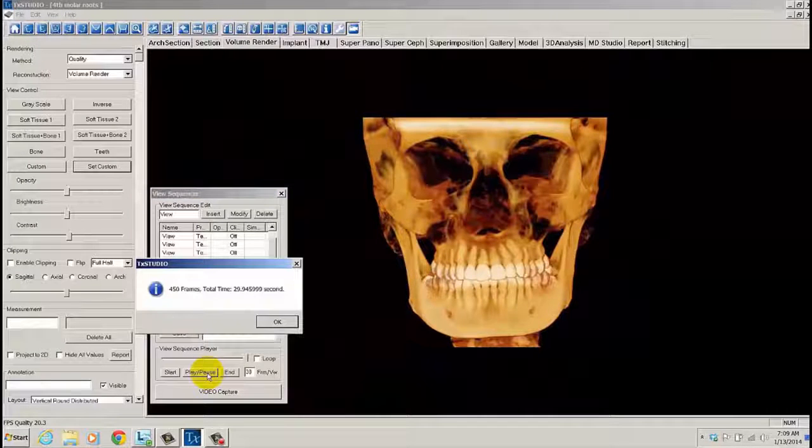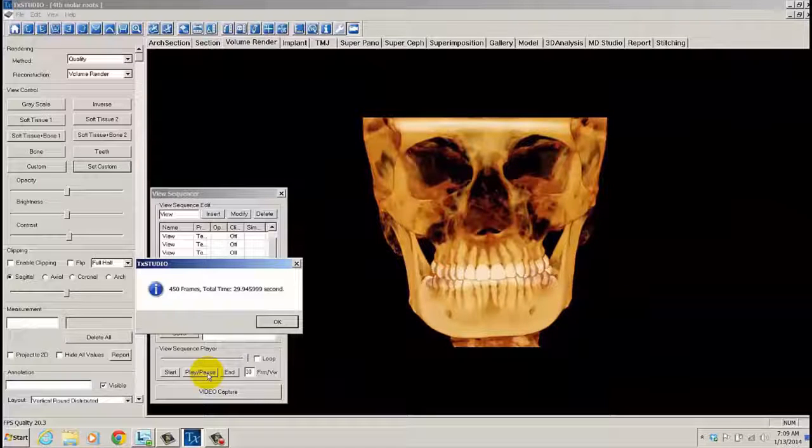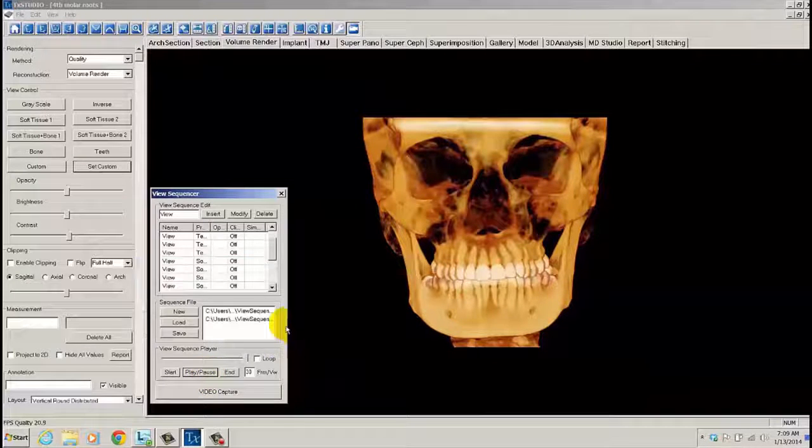I will give you a tip on how to show the transition without the distraction of the text screen. First, let's click OK here, and let's click Loop. So we'll have a continuous loop of movie, and it will go from front to end to back to beginning again.